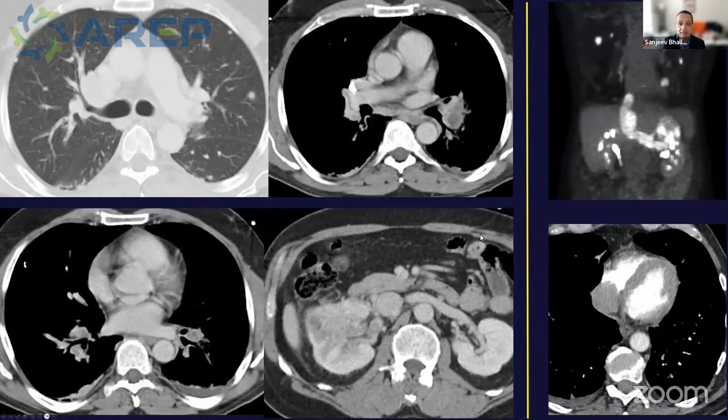And so with this, I'd like to terminate my portion of the discussion because I just wanted to share with you what our experience was and has been with pulmonary emboli. Just to recap, it is important when you're looking for embolic disease to have a checklist. Look beyond the main pulmonary arteries. Of course, we're looking for filling defects, which help make the diagnosis, but it's important to look at the lungs.